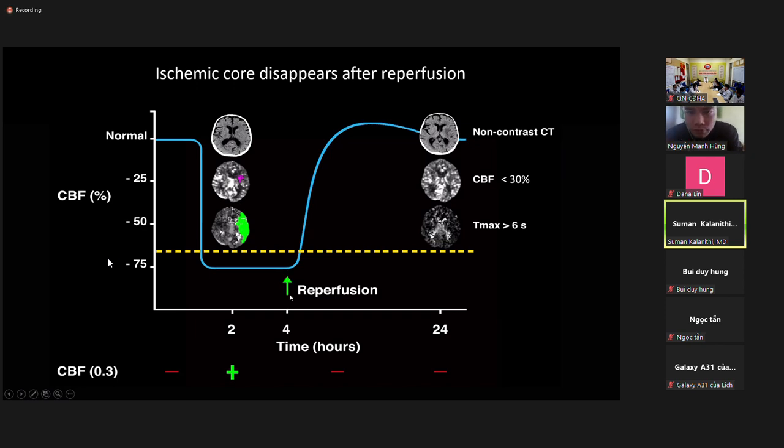So here's a patient who came in and they're a good candidate, and then the clot disappeared. It reperfused in this case. And then you scan them later, and you see they have obviously a new stroke. Actually, it was predicted by RAPID very well. Here's the stroke, the core. But then you look at the CBF less than 30% and you say, wait, why is there no core? Why is this missing? Why isn't there pink here?